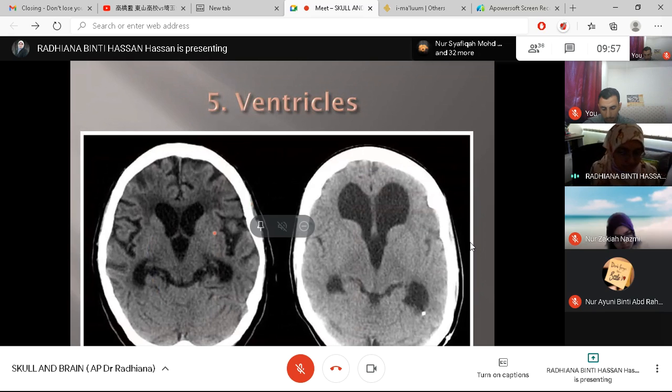Okay, so ventricles again. You see both have dilated ventricles. So what's the difference between the two?